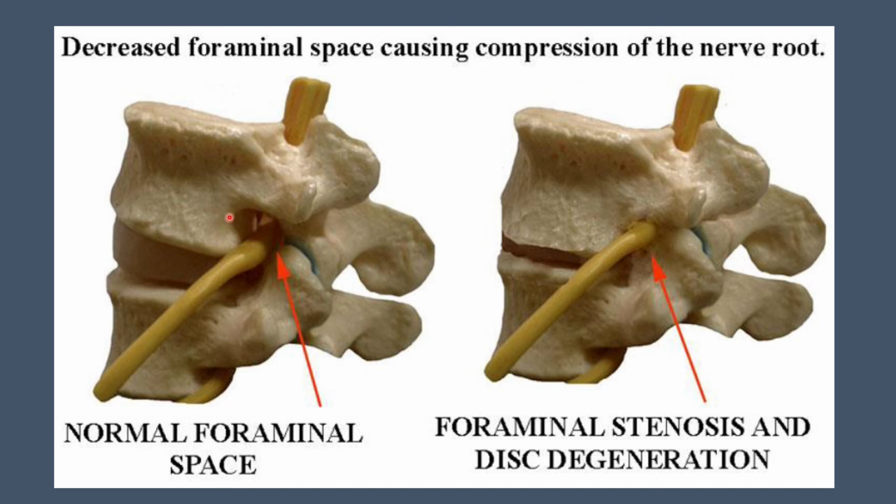So here is, for example, say this is between 4 and 5, and here you have the bone, you have the disc here, and you have the exiting nerve root there. So when you have the disc collapse here, you can see that this is a superior articular process. You can see how the superior articular process encroaches onto the neuroforamen there, causing impingement of this particular nerve root. Quite significant.